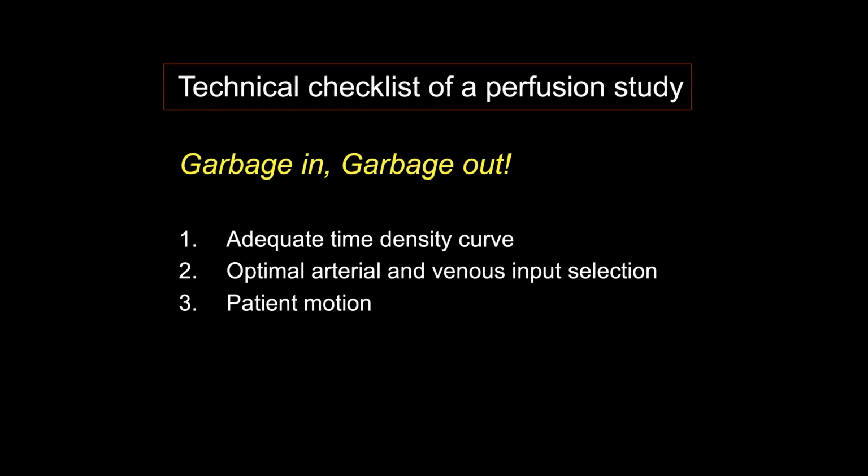Well, I want to check 3 things in my technique. Number one, is there an adequate time density curve? Number 2, did the software pick the optimal arterial and venous input? And number 3, is there patient motion, or is there so much patient motion that I actually don't trust the CT perfusion maps anymore?